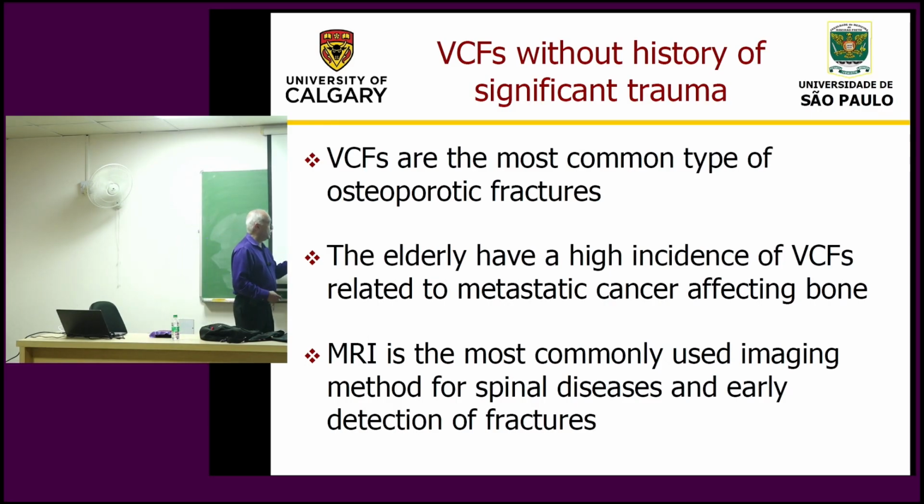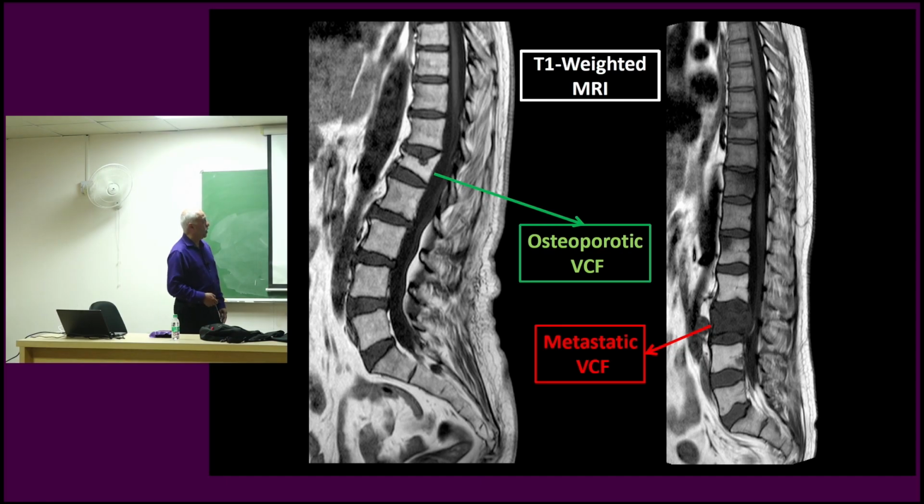MRI is commonly used for detection or diagnosis of spinal diseases and fractures. So CT doesn't help much here. MRI is commonly used, and these images are from the city of Ribeirão Preto in São Paulo state in Brazil.